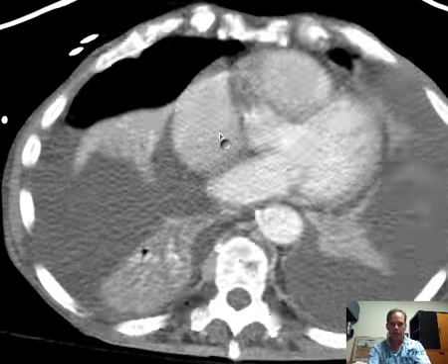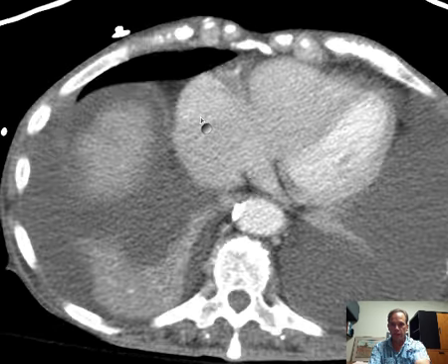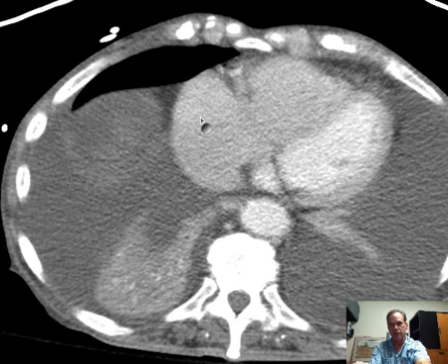The atria have contractility, but they have a very thin wall too. So again, if we look through this heart and we say left ventricle, and it's not because the contrast is brighter there, that could depend entirely on how long after the injection we did the imaging. So this is left ventricle, this is interventricular septum, this is right ventricle.